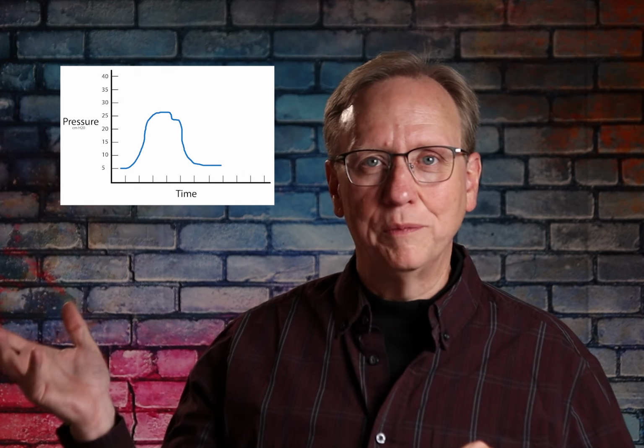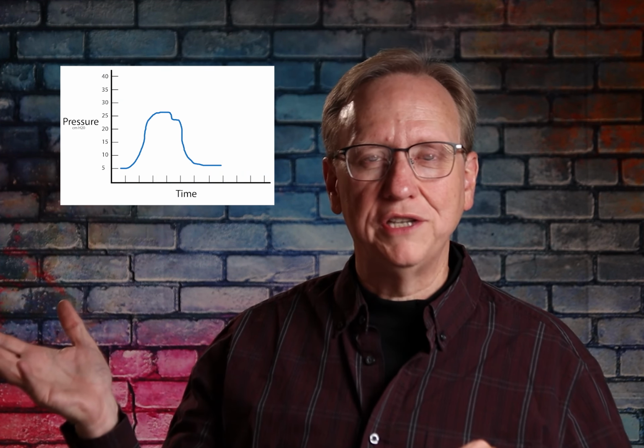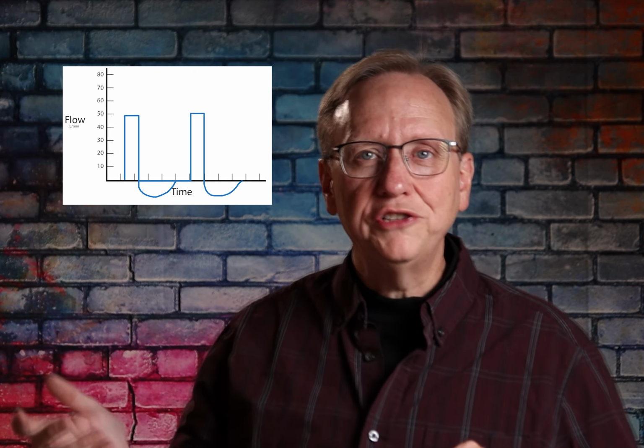So we're going to take a look at some of these ventilator graphics. Now, when it comes to ventilator graphics, know this: there are really three basic things that we're trying to track in the graph. And that is pressure, so we can take a look at a pressure waveform, and that helps us to understand certain things about how the patient's ventilating. But we can also take a look at volume, and we can also take a look at flow. With pressure, volume, and flow, we can look at everything. Today, first, we're going to start talking about looking at those on a graphic.